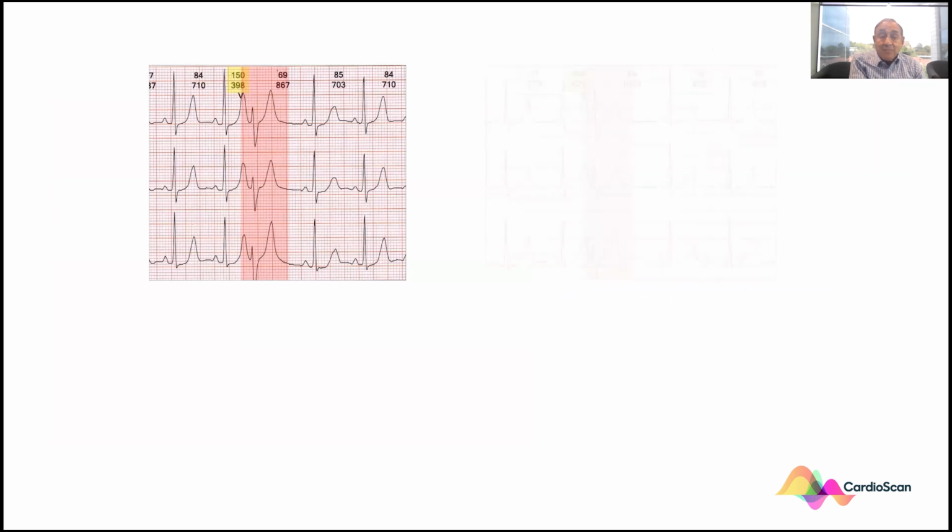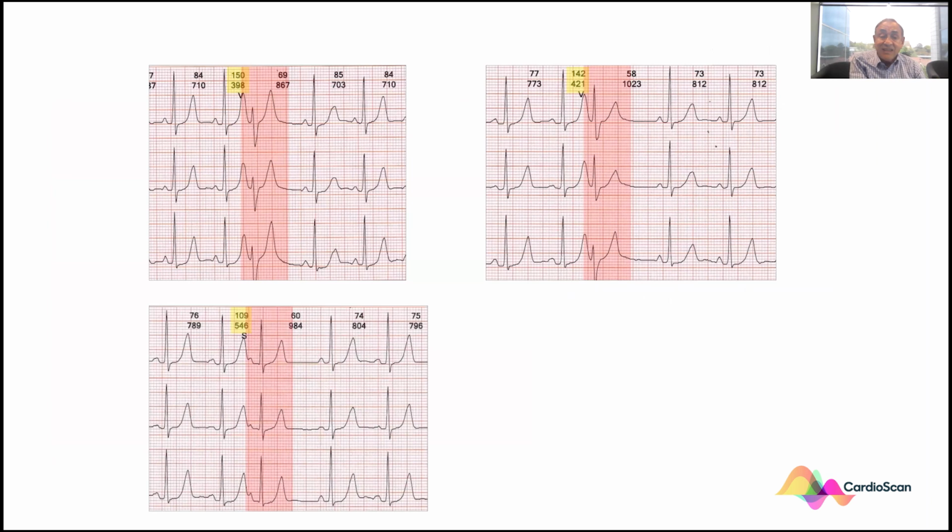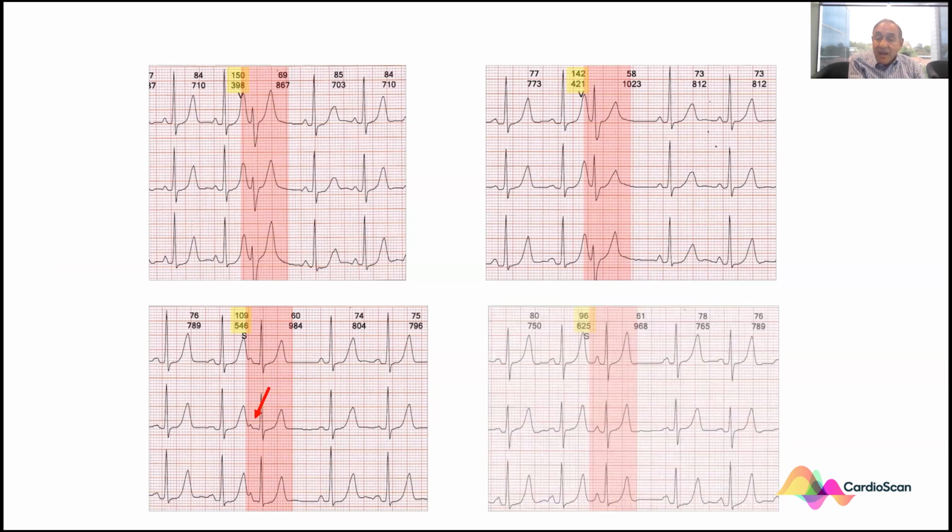You can see then that an ectopic now, which is marginally later, looks very similar, but if you look at the middle strip, you can see that the QRS is quite different. Have it a little later again, and now the QRS has become very narrowed, and there is an emerging P wave. And then another one, which is later still, and this is clearly a classic atrial ectopic and has all the hallmarks of that.